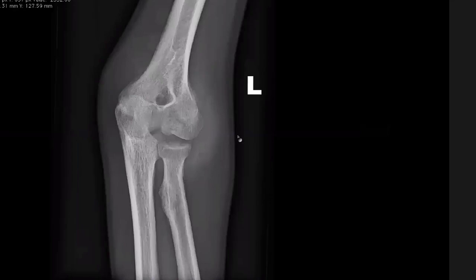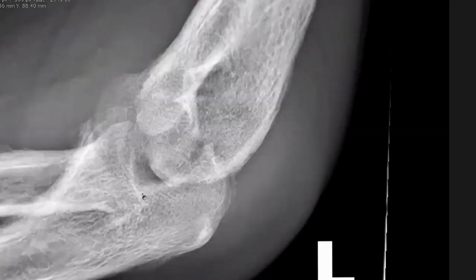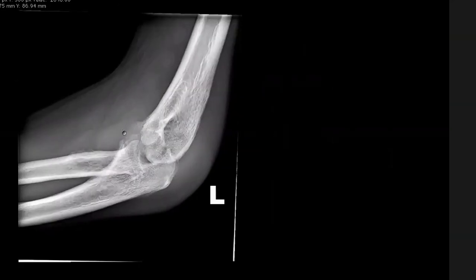So that was the elbow radiograph, right? I want you to look at it. You see this soft tissue swelling here? There is some widening of the radiocapitellar joint. There is some periosteal reaction probably there, but here as well. And you see these olives there, 1, 2, 3. I'll window it for you. These are the lymph nodes, all right? But let's look at the lateral. Again, you're seeing these lymph nodes, this abnormal soft tissue, some joint destruction there. And then I'm going to show you the MR.